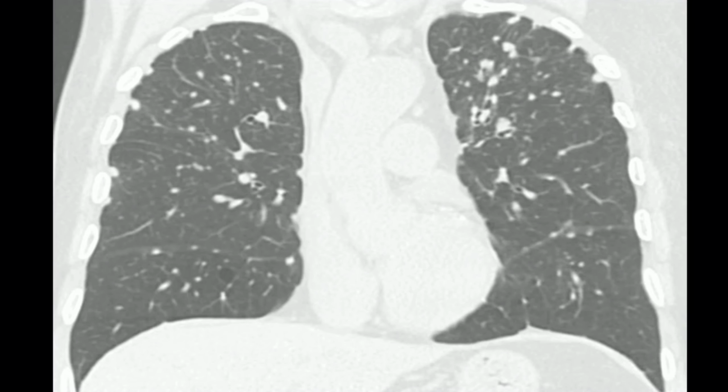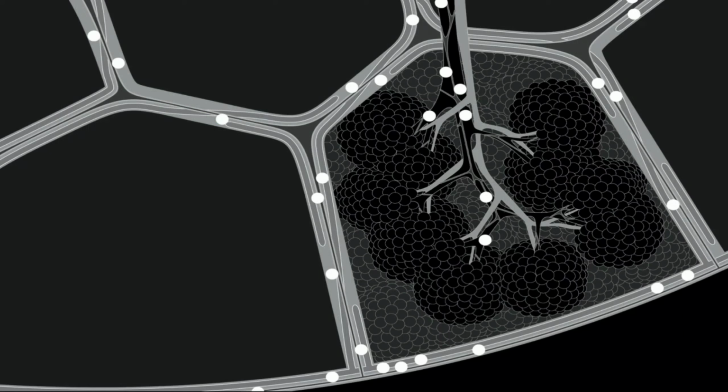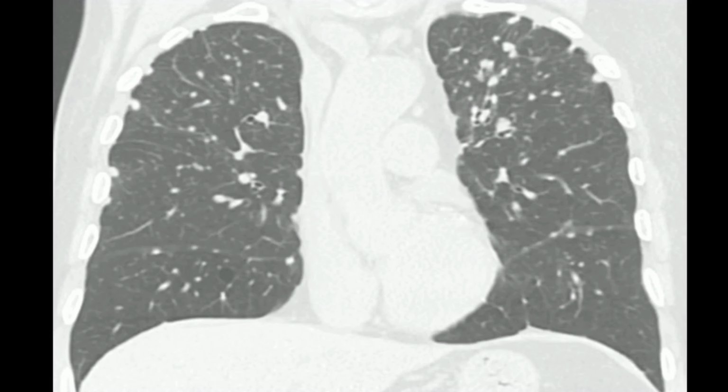This is an example of perilymphatic nodules in a patient with classic simple silicosis. Note the location of the nodules on the fissure and on the subpleural space and pleura. These nodules actually sit on and touch the fissure. There are also nodules in the parenchyma. If you could zoom in, these nodules would be on the septa or along the bronchovascular bundles. Silicosis also has a predominantly upper lobe distribution.